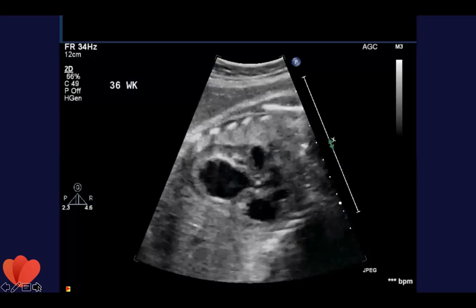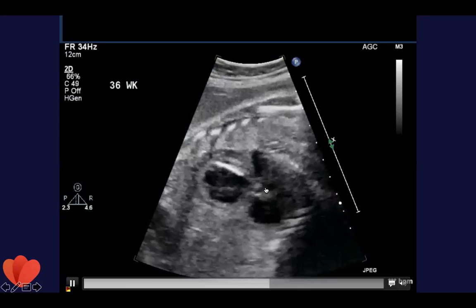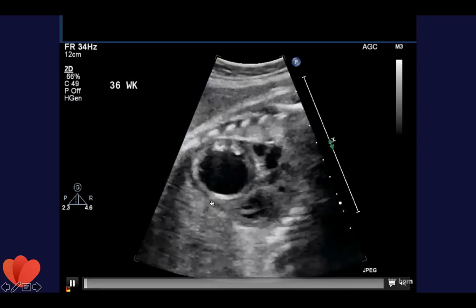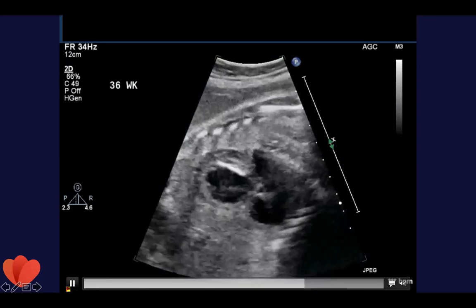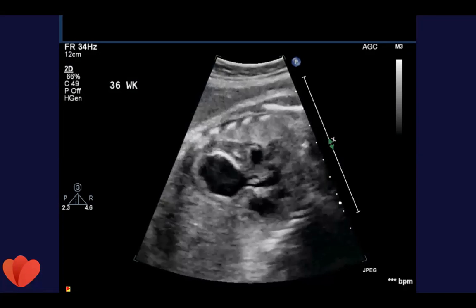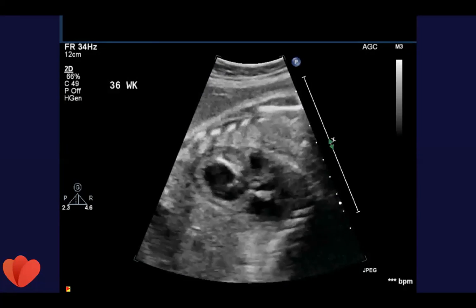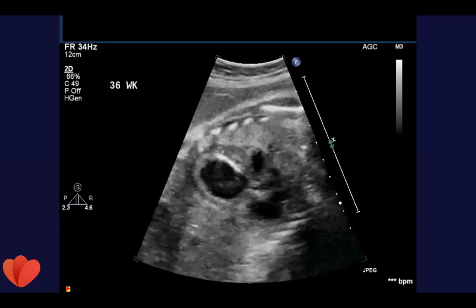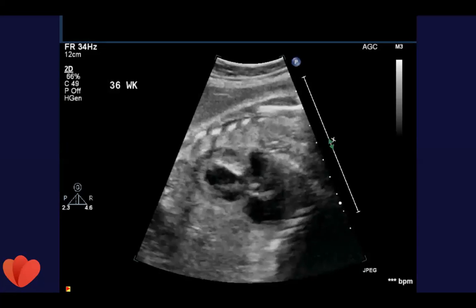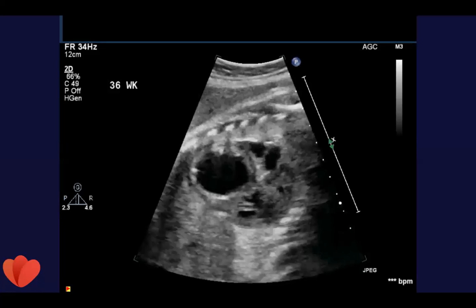This is another example of a similar patient. This patient has severe aortic valve stenosis. The valve minimally opens, as you can see here, and because of all the stenosis, the LV has become very dilated and dysfunctional. So these are sort of the gradual stages of aortic valve stenosis and the spectrum of it. You can have mild, like the first case we saw where the LV was normal size and normal function, to these last two patients. When you have severe aortic stenosis where your LV is dysfunctional, like in both of these cases, usually these patients undergo a single ventricle palliation.